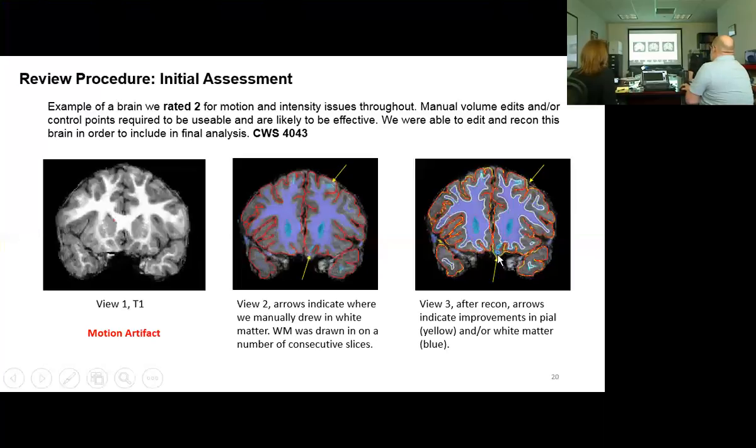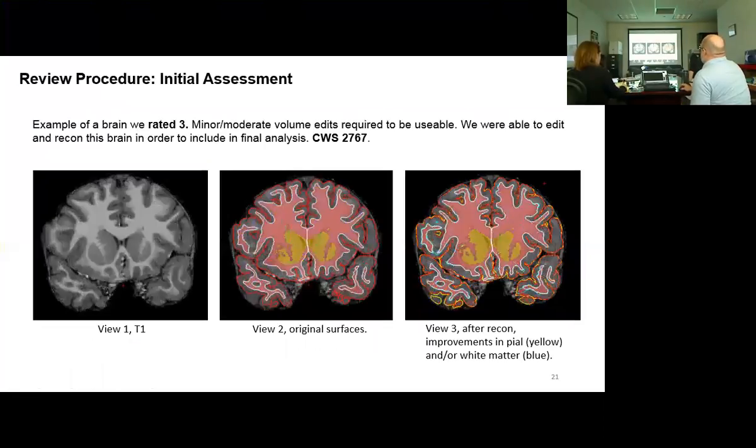Well, that's fair. Here's one, but that's more like a local thing showing just evidence that you can make these things better. But when you look at this surface here, it's really tight. This is all cortex here, all around here, it's just underestimating it. You could probably come up with another 2 that's going to be more clear about what kind of errors you get, but it's kind of messy, but we can fix it.